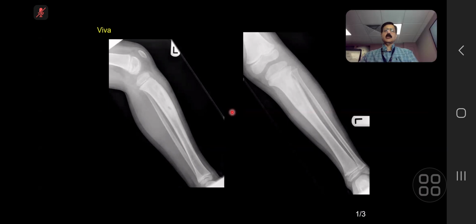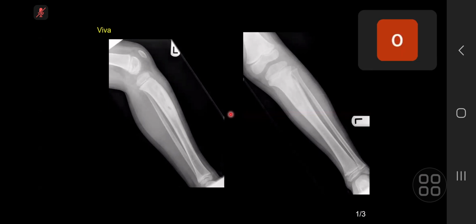I'm presented with left leg radiographs of a skeletally immature patient. There is ill-defined lucency seen at the proximal shaft of the left tibia with surrounding cortical thickening and sclerosis. There is also periosteal reaction seen on the AP radiograph, I think medially. I can't see any soft tissue extension, but maybe there is some surrounding soft tissue edema.